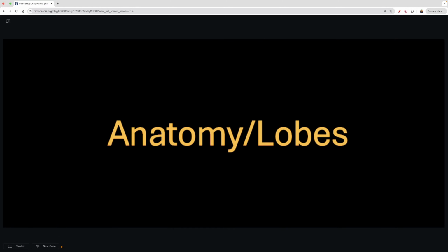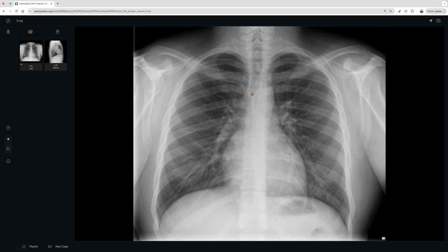So let's move on to normal anatomy in the lung lobes. One thing when it comes to radiology is that radiologists want to be super systematic, right? A radiologist is responsible for everything on this image. If there was a little hyperdensity down here and it was a staple or a bullet or whatever the case may be, you would have to report that. That is part of a radiologist's job. So with that being said, they have a search pattern.